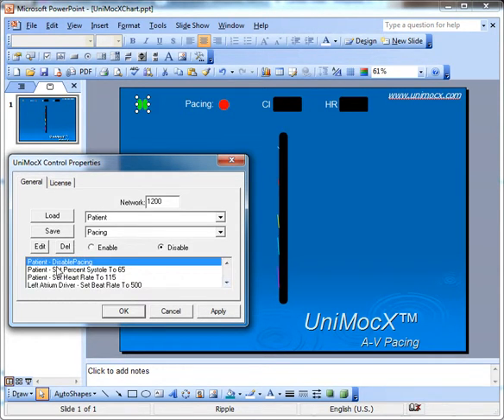Okay, we set the percent systole to 65. That essentially reduces the filling time of the heart, and therefore we'll get a small reduction in our cardiac output. That way we get our cardiac index to read the way we're looking for. We set the heart rate to 115 beats per minute. We want to show tachycardia so that we can present that to our audience.